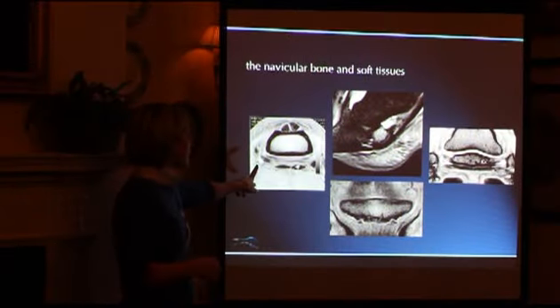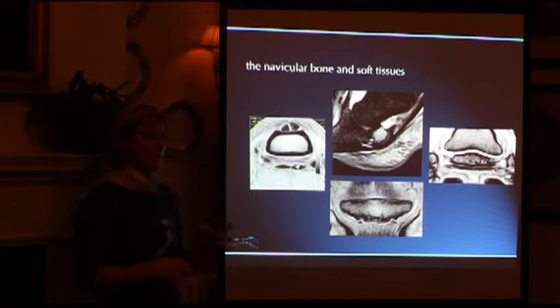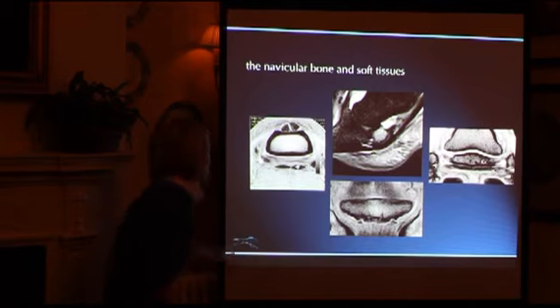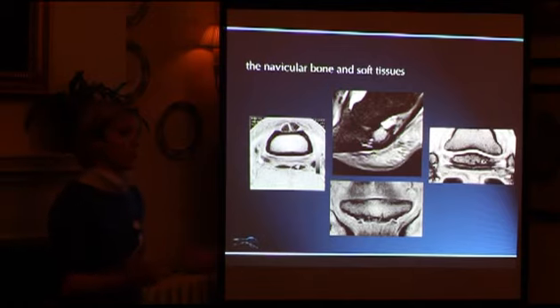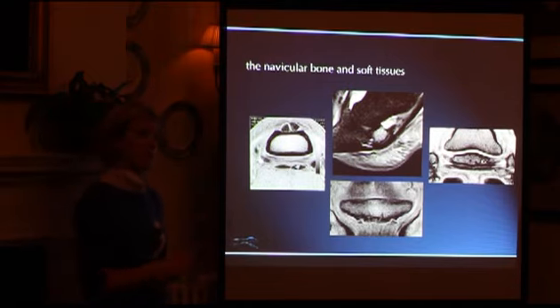So MRI in general has been used historically and is still very, very good at detecting lesions in the soft tissues of the foot. So this is a deep digital flexor tendon injury on this lobe of the deep digital flexor tendon here. And this type of image is very, very useful information. There is virtually no other way of seeing that unless we do a CT scan under general anaesthetic. But you can't ultrasound that area, no matter what Denmark tells you. It's very difficult.